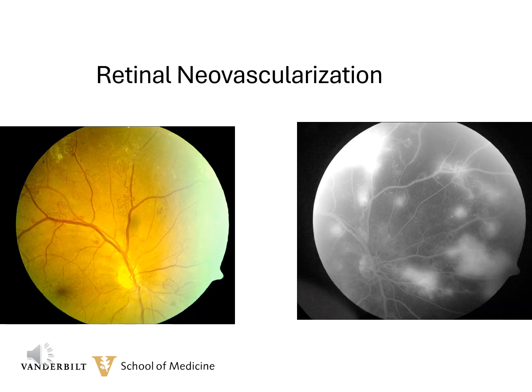Here's a very typical clinical and angiographic pattern of proliferative diabetic retinopathy. You can easily see the neovascularization along the supratemporal arcade and along the vein that extends from the nerve up towards 12 o'clock. There are also associated areas already of fibrosis in each of these areas. And then down at 4 o'clock, about a disc away from the nerve, you can also see some neovascularization.